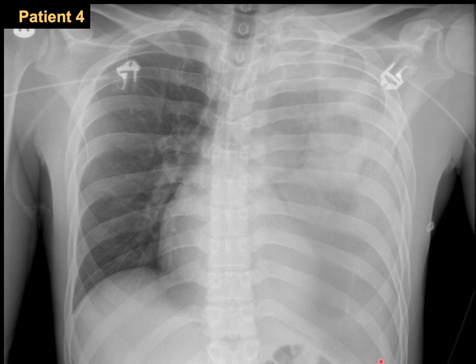And if you remember, the definition of the massive hemothorax clinically is to have more than 1,500 ml of blood when you insert your chest tube, or 200 to 400 ml per hour for 3 to 4 hours successively. When you continue A, B, C, D, diaphragm and bones, the diaphragm is very pushed here, not clear, and here it's clear. Bones, well, what we have here is okay from bones, and the history does not give us any clues about the possibility of having any bone injury. E, I can see the electrodes here and don't have any soft tissue injury, the tube, maybe the mask of oxygen. So this patient is having massive hemothorax on the left side.